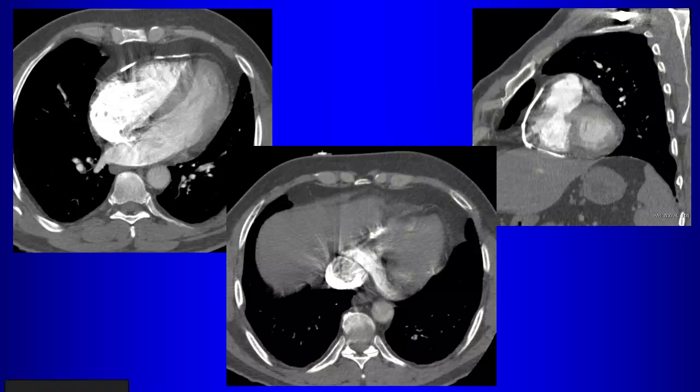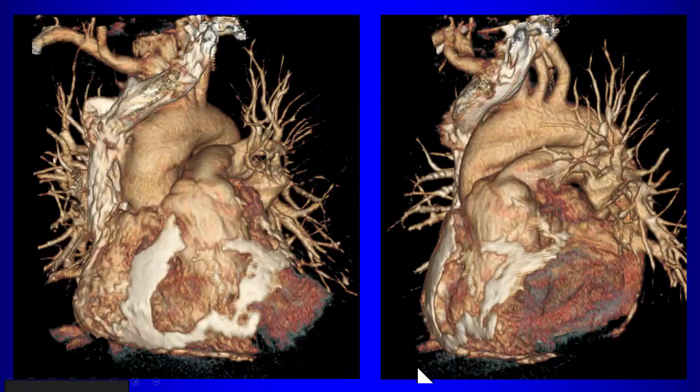So there's evidence that there's increased filling pressures here on the right side, so that you would suspect then that this pericardial calcification is significant, and this patient might have constrictive pericarditis. So these are other signs that we would look for. Even on a non-cardiac gated CT scan, you might be able to make some of these judgments, right? And then here on this volume rendered view, you can see that this pericardial calcification is really much more extensive than what you would imagine just looking at a series of axial views, okay?